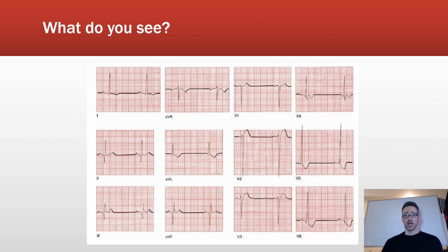Okay, so here, again, before just going through this, you could probably just pause the video and take a few minutes to assess it for yourself before I go through it. But if you're just eyeballing it, you can see it especially here in the precordial leads. Let's take a look at V5 and V6 for a second here. Look at the size of this amplitude here.